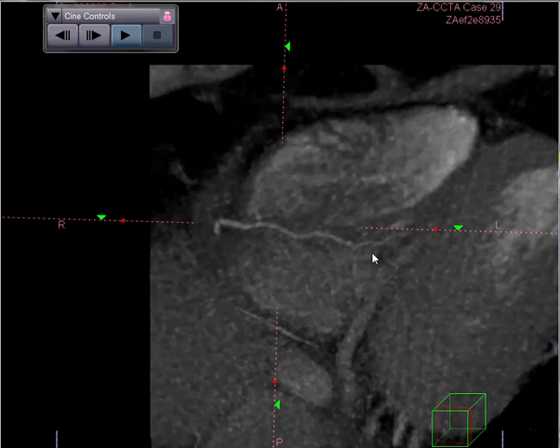So in summary, in this 49-year-old man who has exertional chest pain, although he had a normal stress test, we found clearly obstructive disease in the first OM. We found borderline obstructive disease just because of length in a mixed calcified, non-calcified situation in the mid-LAD, and we have a right coronary that's quite not satisfactorily evaluated. So given the fact that this patient has had a stress test, I would urge that this patient would be appropriate to have coronary angiography, and then a further definition of these areas, and perhaps a focal intervention such as an angioplasty or stent placement.